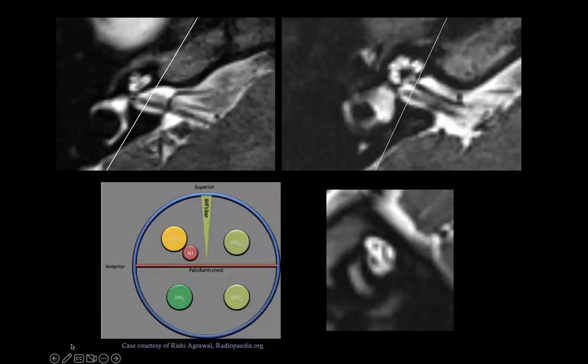You basically create this parasagittal reformat, and you should have these four nerves, actually two very well separated, that are the eyes of this face, and then the mouth, that are two nerves linked together. In order to remember which nerve is which, remember that 7 up and cock down. So the 7th nerve is up, superiorly, and then you have the cochlear nerve. These two that are the mouth of this sad face, sometimes it's a smiley face, are the vestibular nerves, superior and inferior. This is from Radiopaedia.